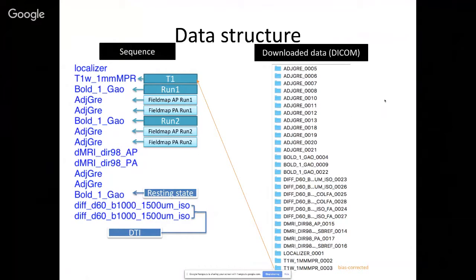This image is bias corrected. Maybe you don't know the meaning of this word. Without the bias correction, the outer layer of the brain will look brighter than the subcortical regions, and the scanner automatically applies a correction to improve the homogeneity of your image. The folder above, numbered 002, is the raw data without bias correction, but we don't need this one. What we need is 003.